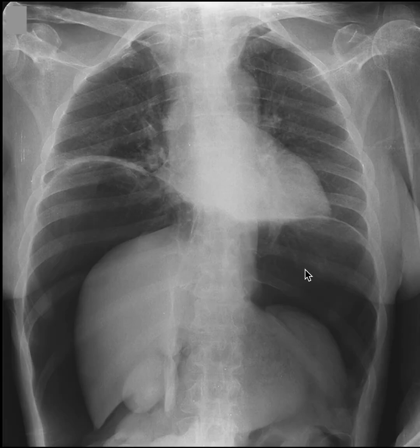How do you know that? The key is to identify the diaphragms. Remember, when you're looking at an x-ray, it's like mirror image. So this patient is facing us. This is the patient's right side, and this is the patient's left side. So this thin, horizontal, radiopaque line is the right hemidiaphragm. And this one on this side is the left hemidiaphragm.